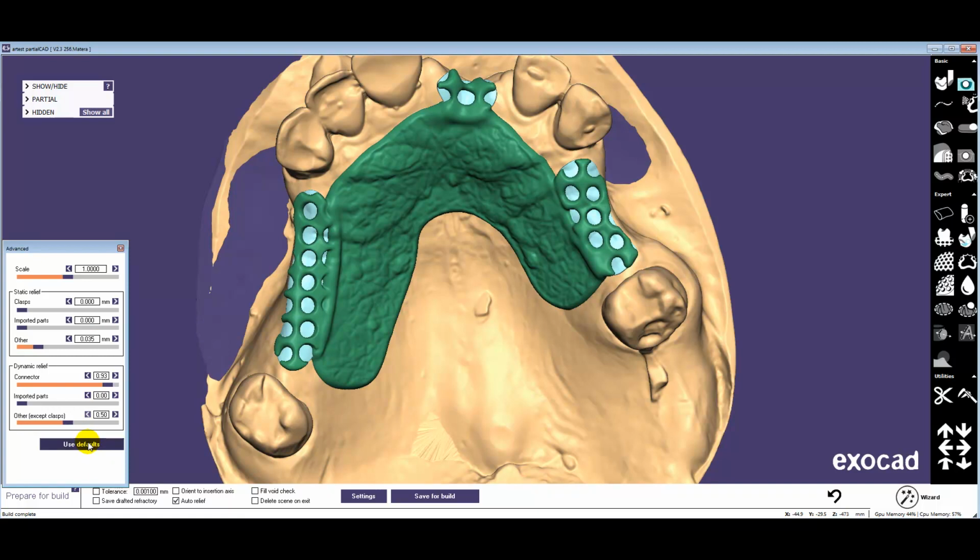So one other thing I want to show you quick. Michael Enger had a clever trick. You look over here, right? We have the different settings for clasps in autorelief. Clasps are identified with the clasp curves, and I've posted a video earlier where the clasp rest, this area in here inside the clasp, since it's free-formed and it doesn't use the curve, it wasn't being correctly identified, so we have some offset there.